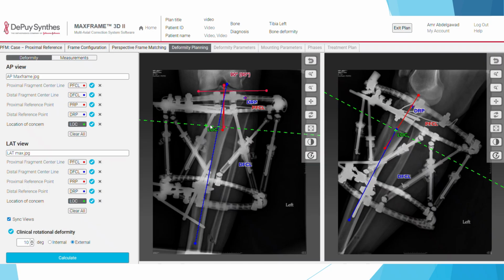Sometimes, let's say this is a valgus deformity and you're too worried about the nerve, you will move the nerve point, for example, from here to here, and then leave it here so the computer does not get confused. And you will say that you don't want this to lengthen more than 0.5 millimeter. You don't want to stretch the nerve more than this. So this is an arbitrary place that you will pick.